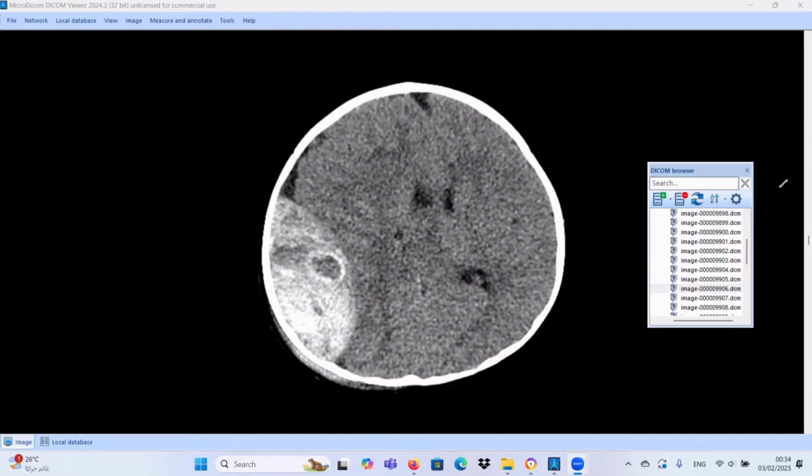Today we will start our Emergency CT Brain course, and I would like first to invite you to watch our previous video, the checklist for the CT Brain. And this is our case for today. Let's go to our cases.